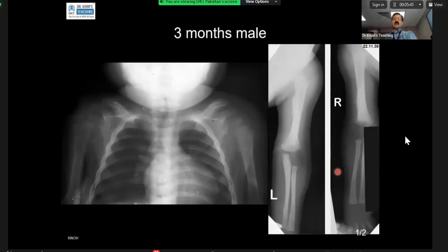This is your last case, and then we will go to candidate 6. Okay. What is your diagnosis here? Okay, go through your findings, should I say. In this 3 months old child, x-rays which have been provided to me, I think there is some periosteal reaction which I can see in the right distal humerus, and in the ribs, in the clavicles again I can see that there is some periosteal reaction.